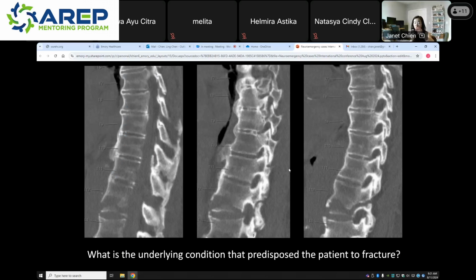Like essentially the spine is like a stick, kind of like ankylosing spondylitis, and with any minor trauma, they can easily fracture. So if I see a patient with DISH or ankylosing spondylitis and I don't definitely see a fracture on CT, I recommend an MR if the clinical team still has concern for underlying non-displaced spinal fracture. These can be very subtle on CT. In this case, no, because it's displaced, but non-displaced fractures can be very subtle and it's much easier to pick up on MRI.